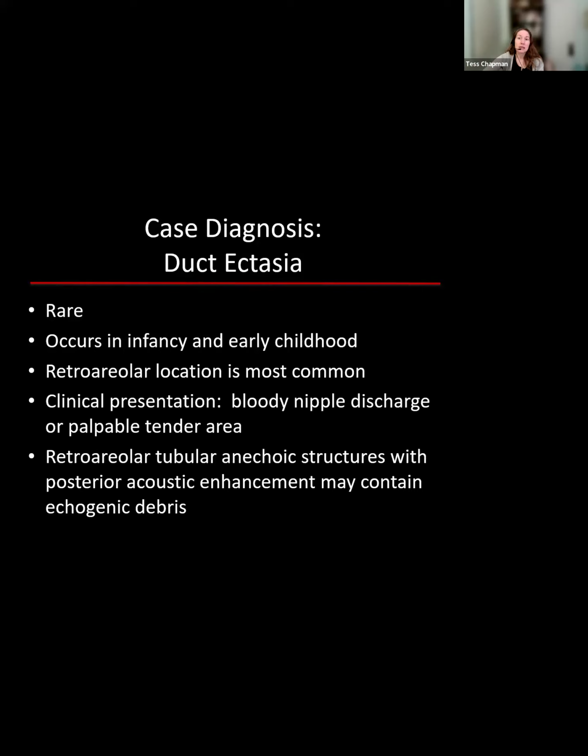And so we'll see these tubular anechoic structures deep to the nipple with posterior acoustic enhancement. And it may contain echogenic debris as well, and that debris might reflect blood products, or it could be infected fluid, or it could just be sediment.